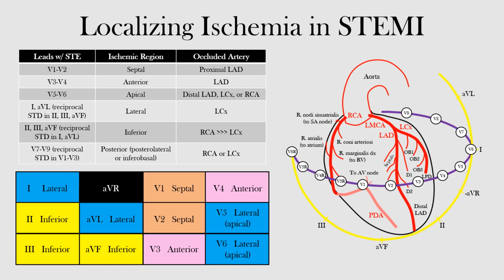So let's take a look at this. I'll walk you through this, and I'm talking about these leads. So notice we have our frontal leads. Here's 3, here's AVF, 2, AVR. This is negative AVR. Remember AVR would be in this case up here. So that's negative AVR. Here's lead 1 and lead AVL.